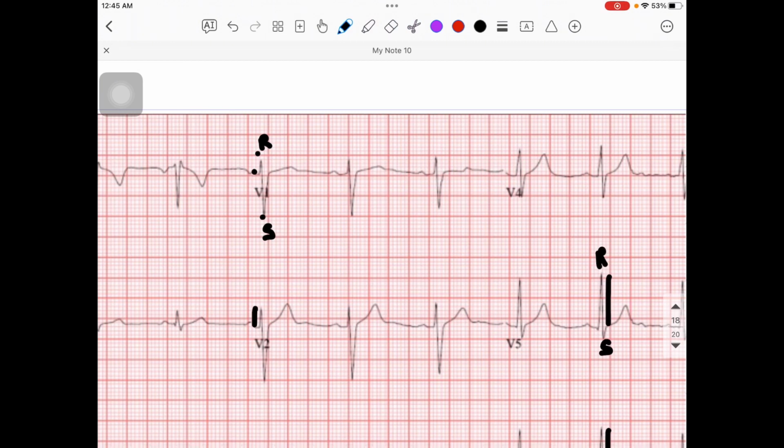Sometimes you must be hearing physicians talking about some patients and saying there is a poor R wave progression, or a poor progression in the ECG. It means they are talking about the R wave progression in the ECG particularly. It is very easy to find out. Just look at V1 to V6 and look at the R wave heights. If the R wave heights are increasing from V1 to V6, it means the person has a normal R wave progression.